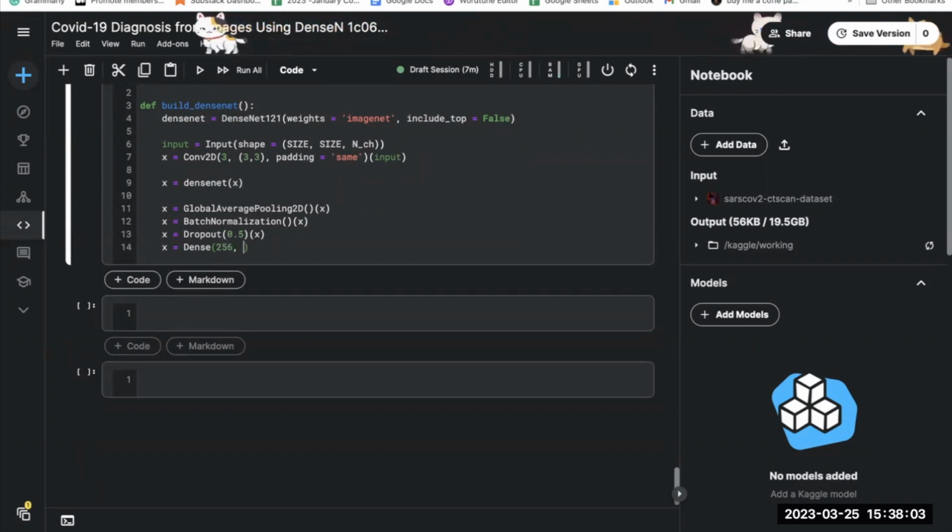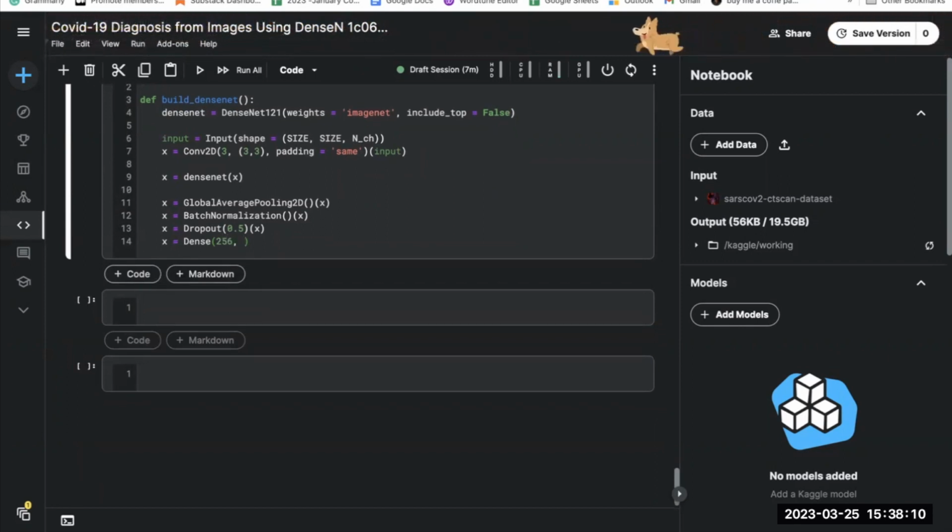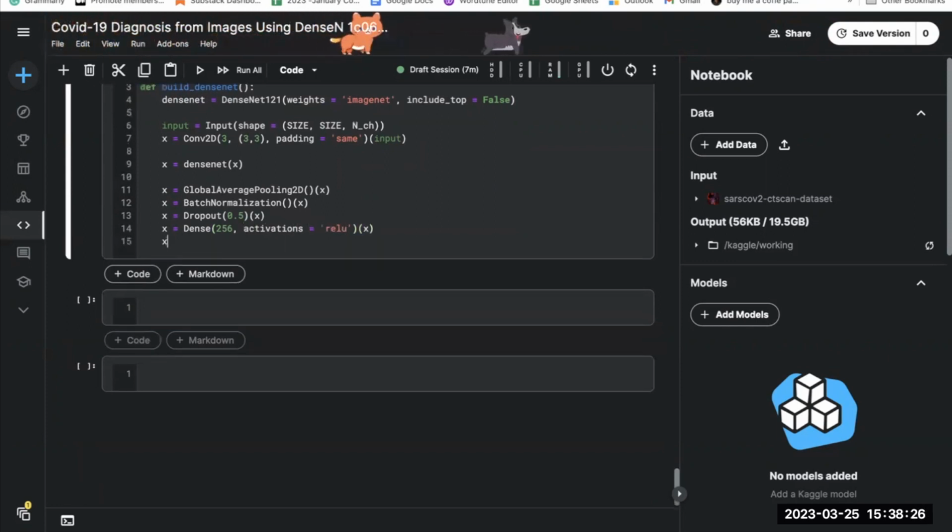Don't worry about this. I will explain when I write this code. I don't speak while writing the code because it prevents some errors from happening. I can fully concentrate on writing the code, and that's why I can make sure that I don't get any errors. But I will explain to you guys once I have completed this.